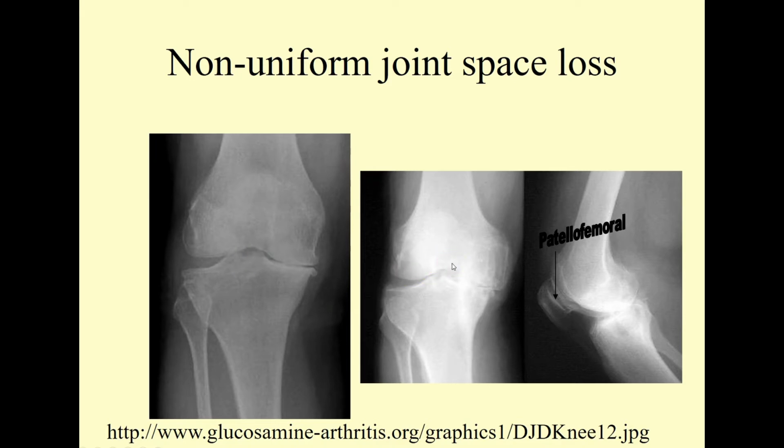Another example, different patient farther down the DJD line, a very thorough loss of joint spacing on the medial side, really medial subluxation of the femur versus the tibia. And again, in this case, tibial osteophyte formation, but no evidence of femur. We also have to recognize that the patellofemoral joint can become bound up in this DJD of the knee scenario.